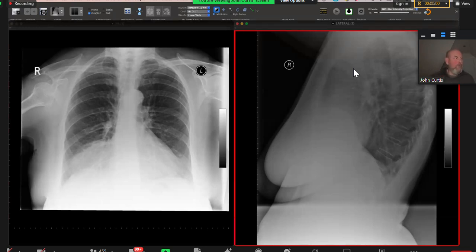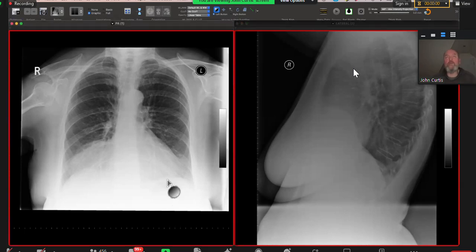Okay, have a look at that one. Okay. So I'm provided with the chest radiograph frontal projection of a skeletally mature patient, in which I can appreciate that there is an opacity that is seen in the right middle and the lower zone that is obscuring the right cardiac border and part of the right diaphragmatic dome as well. So as it is, there's loss of the silhouette sign of the heart as well as the diaphragm.